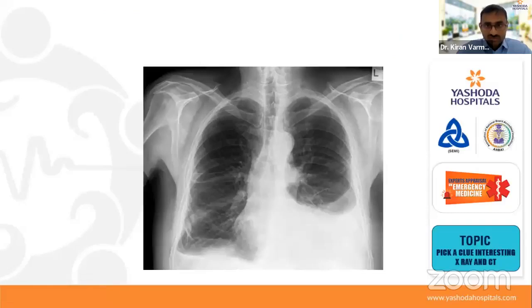So how are we going to differentiate between a pneumonia and pleural effusion? Only a single word answer. There is obliteration of the costophrenic angle on the left side. So that alone is enough to say it is a pleural effusion on the left side. Why pleural effusion? Secondary to tuberculosis. Then you should read about types of pleural effusions. Then you have to read about Light's criteria as well to know whether it is exudative or not.